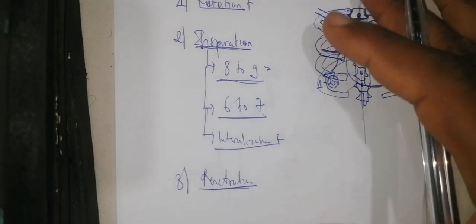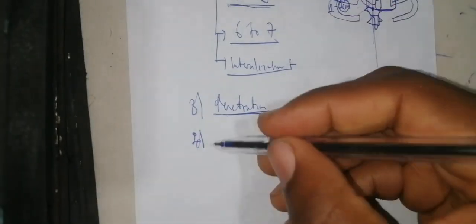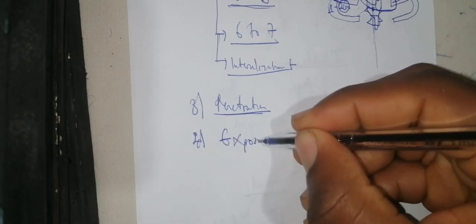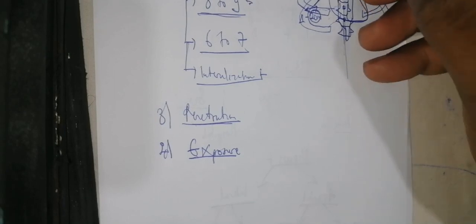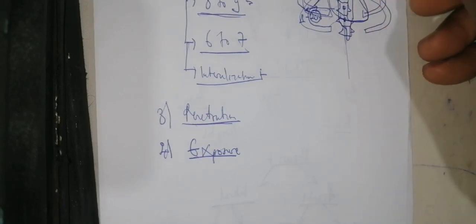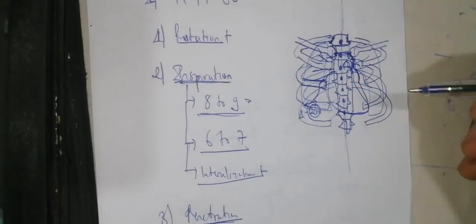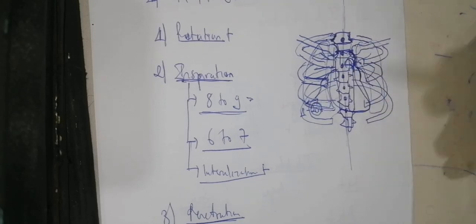Are you understanding? Now, the fourth element after the penetration, we have the E, which is for the exposure. Is it clear? Now, for the exposure, you need to evaluate the lung fields. If you see completely the lung field, it is a good exposure. A good exposure is one where you can see completely the lung field.